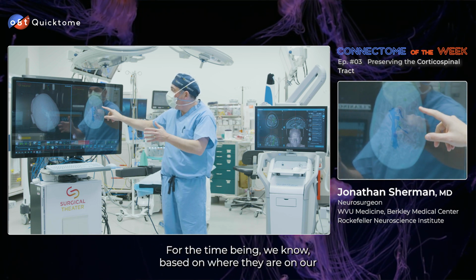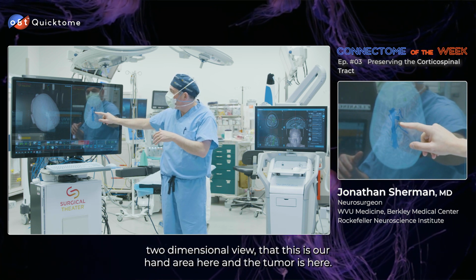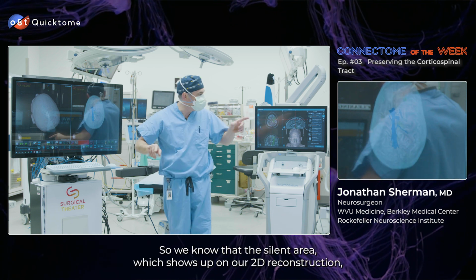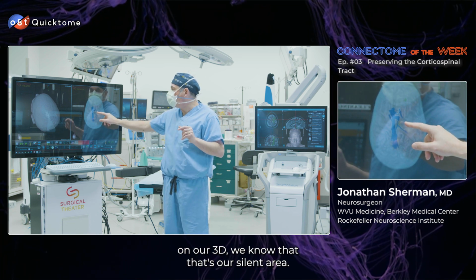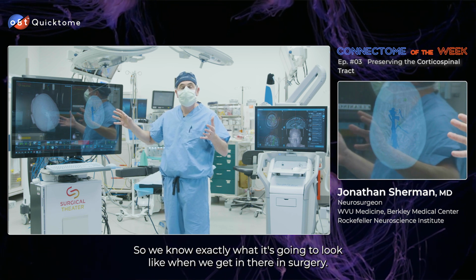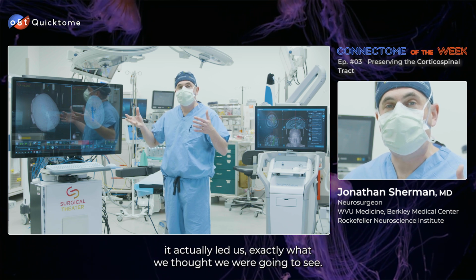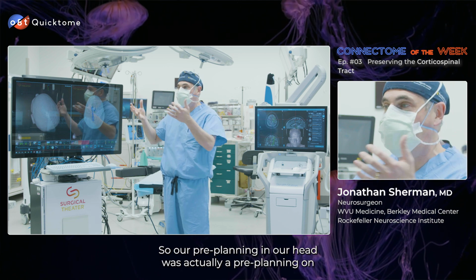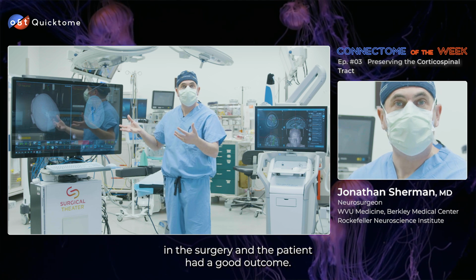For the time being, we know based on where they are on our two-dimensional view that this is our hand area here and the tumor is here, and we see once again those veins, so we know that the silent area, which shows up on our 2D reconstruction, on our 3D, we know that that's our silent area, so we know exactly what it's going to look like when we get into there in surgery. And then when we do the surgery, and we actually did the surgery last week, it showed us exactly what we thought we were going to see. So our pre-planning in our head was actually a pre-planning on 2D and 3D reconstructive images that bore out in the surgery, and the patient had a good outcome.